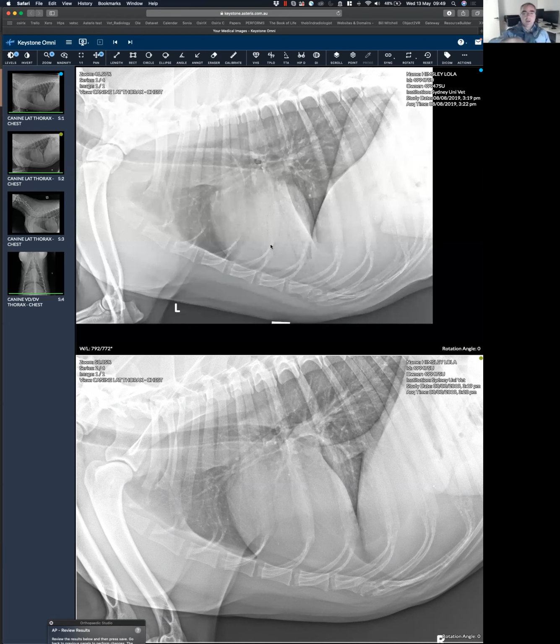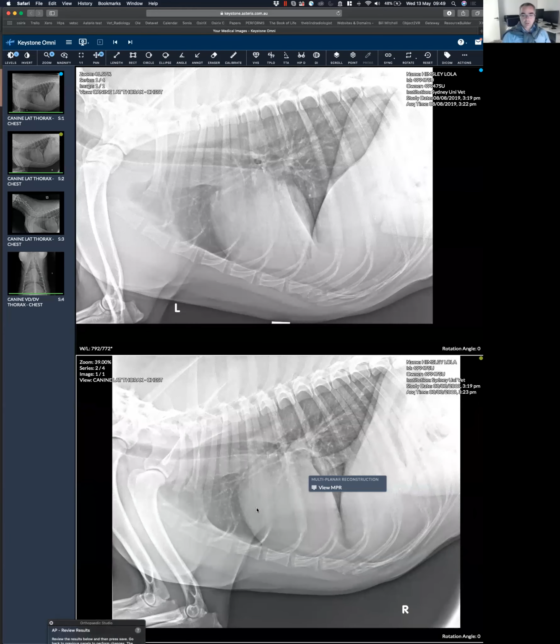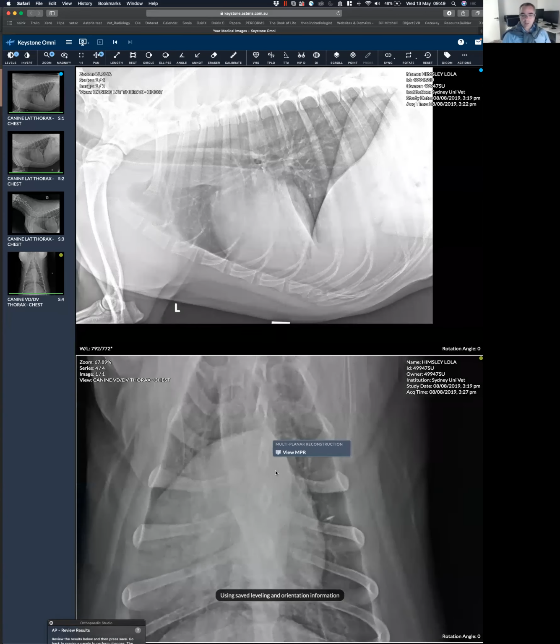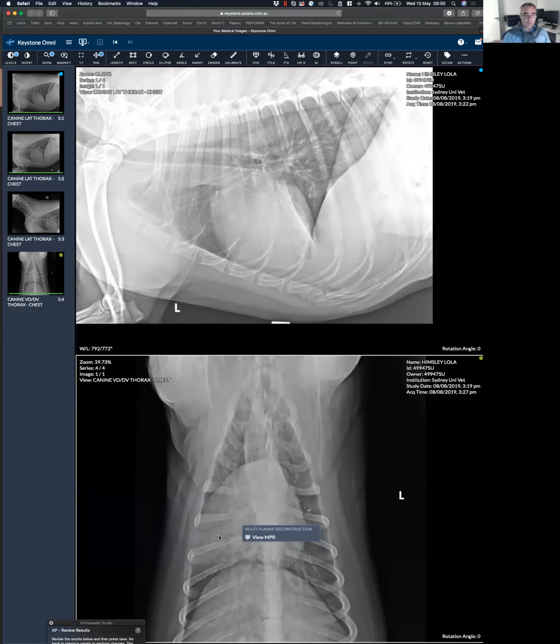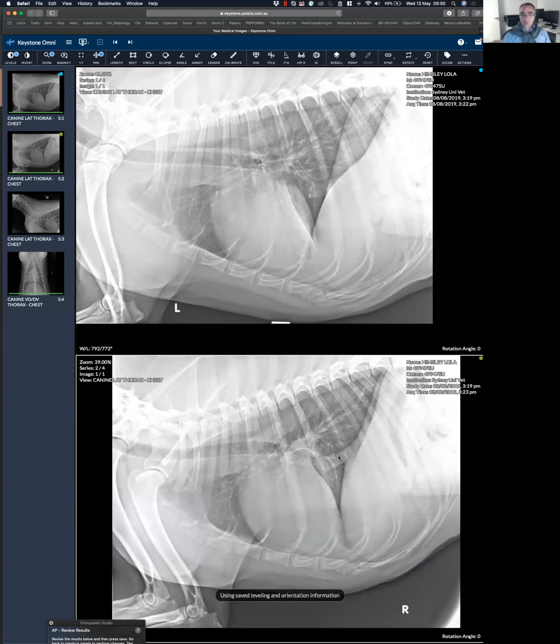After saying all of that, I wanted to come to this point. Are you a bit shocked by your inability to see it on this radiograph? The changes are severe. I'll bring them back here. Those changes are severe. That lung is pretty wide. There is a lot of fluid in that lung. But if we come to this projection, we don't see it. We see it here.